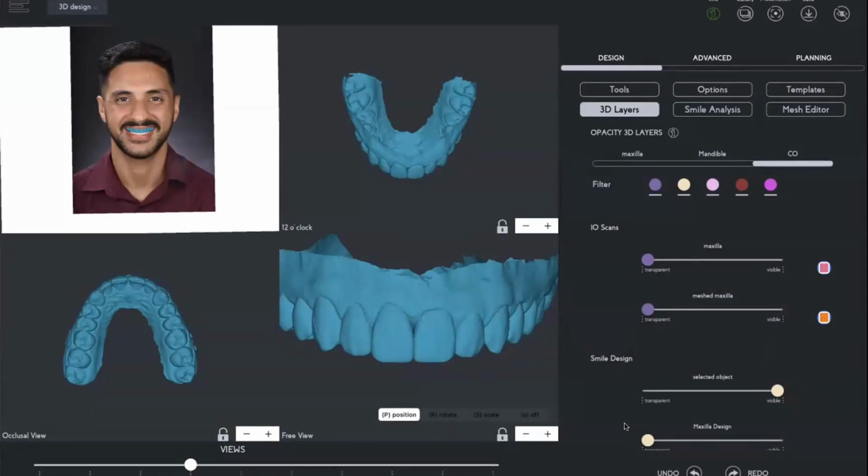What we worked on was patient communication, explaining what needs to be done, what can be done. Smile analysis, we analyzed the axial angulation of the teeth, the gingival margins, the triangles. So we actually had a better and deeper discussion about the smile characteristics and smile harmony than trying to fight with the technology. Right? Good. That's the automatic mockup.